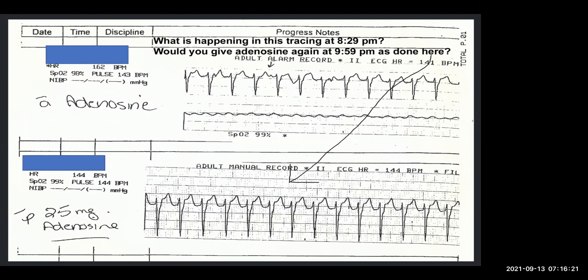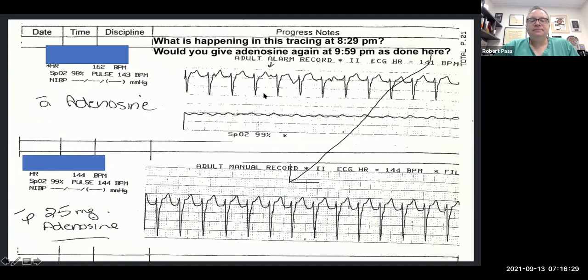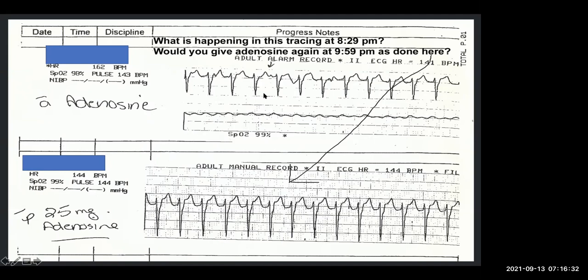There is one which seems to land before the QRS, right at the time of that arrow. And then after that, it's difficult to say if I see the P wave. For the next two, I think it's in the T wave.